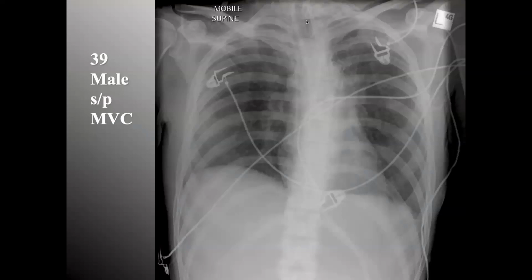So the first thing I'm going to note here is I'm going to look at my airway. Is it midline? Well, I'm going to find my spinous processes, and I'm going to say it does look fairly midline, but there's a little bit of angle off towards maybe the patient's left as we get near to the carina. That's a little unusual.